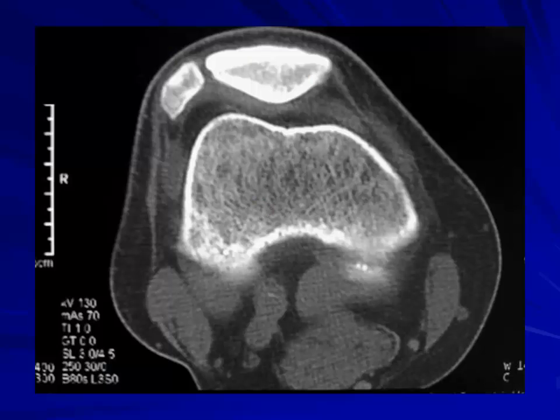Gopi showed you one scan, so any volunteers, what is this? Is this a fracture?